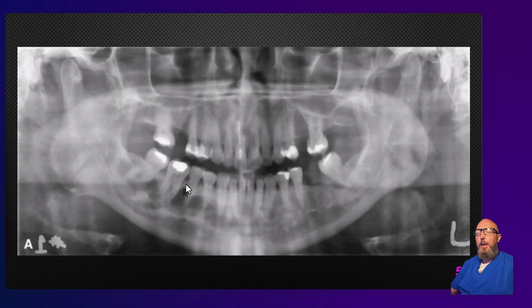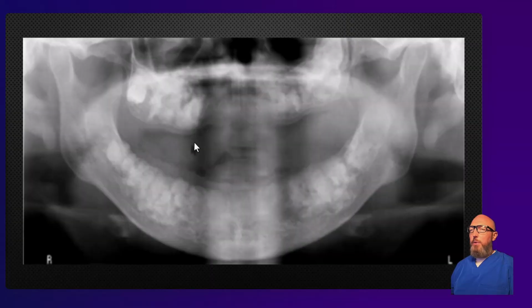And these can hide periapical inflammatory lesions, so a lot is going to rely on your vitality testing of the teeth. And if the tooth is non-vital, especially if they have a large caries or restoration like this encroaching the pulp, then you've really got to rely on your vitality test. This one, if we didn't just cover Cemento-osseous dysplasia, can be confusing for a lot of people because it looks mostly radiopaque with some mixture in here, but this is just a very mature, you can see it's an older patient, a mature Cemento-osseous dysplasia, and it's the Florid type, right?